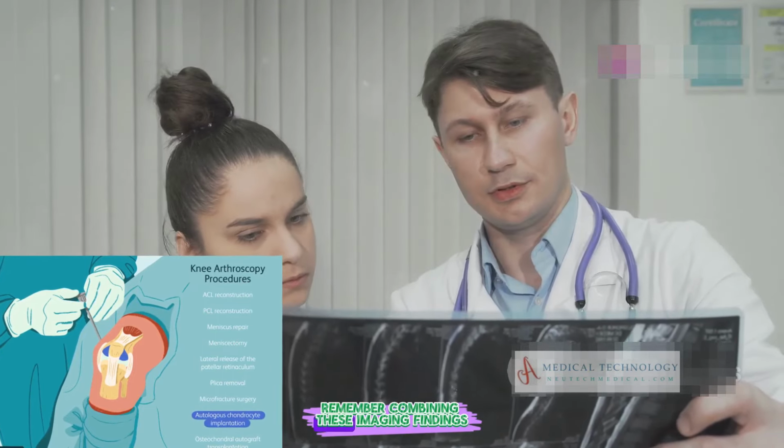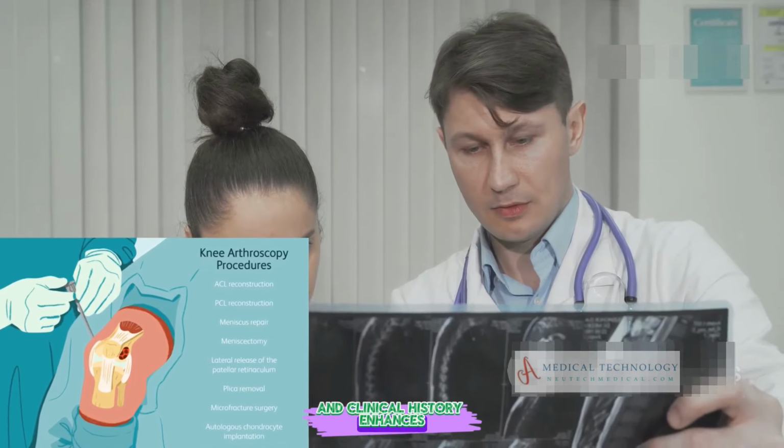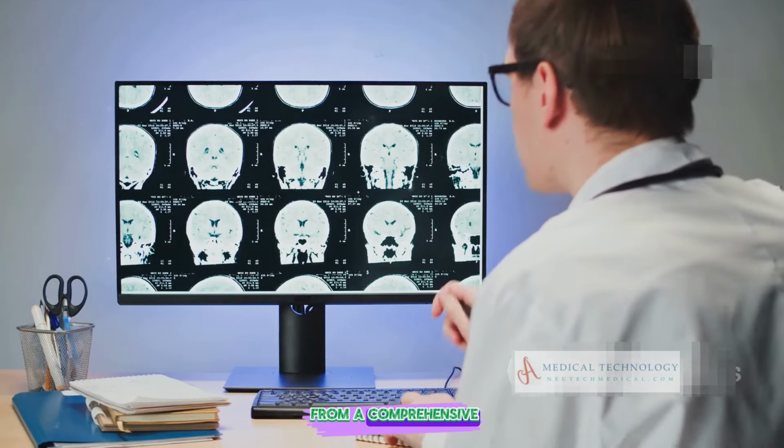Remember, combining these imaging findings with the patient's symptoms and clinical history enhances diagnostic accuracy. So, while the MRI provides the images, the full picture comes from a comprehensive clinical understanding.